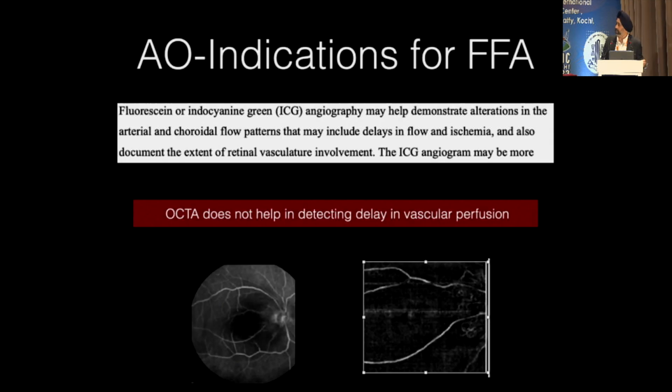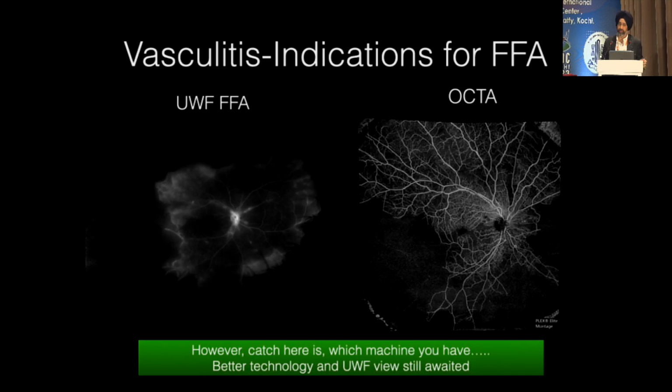What about arterial occlusion? It will not detect the delay in the perfusion, but yes, the scans look good. Just to say that there is no perfusion, we don't need FFA there. The OCTA suffices our purpose.